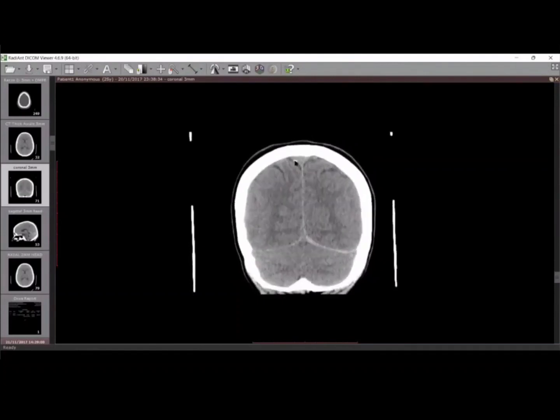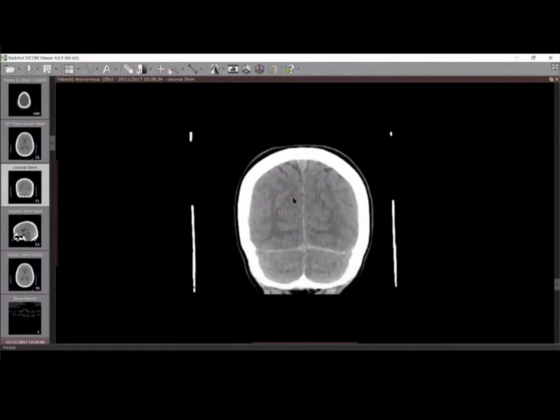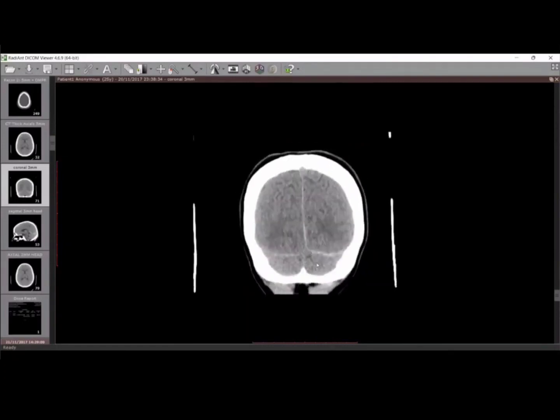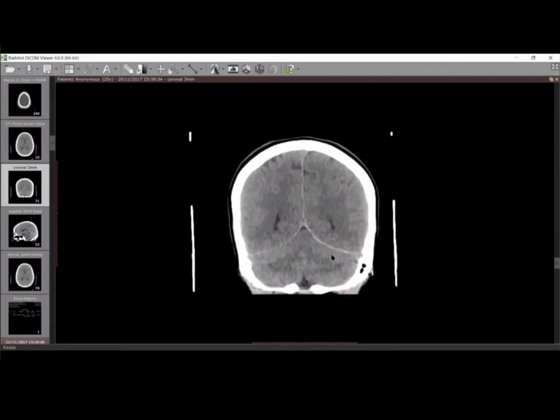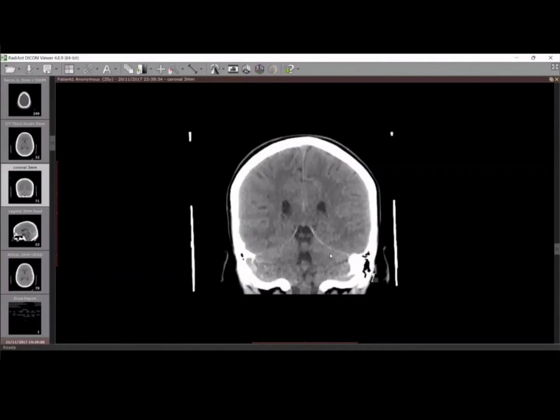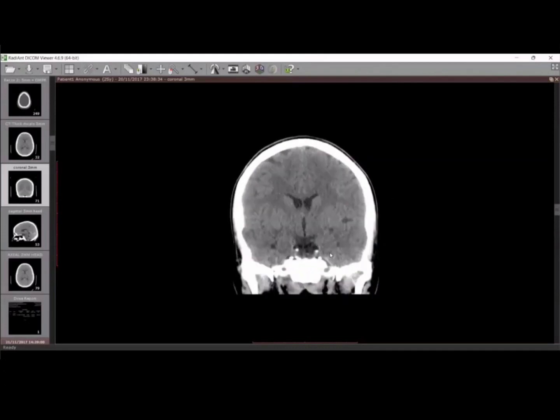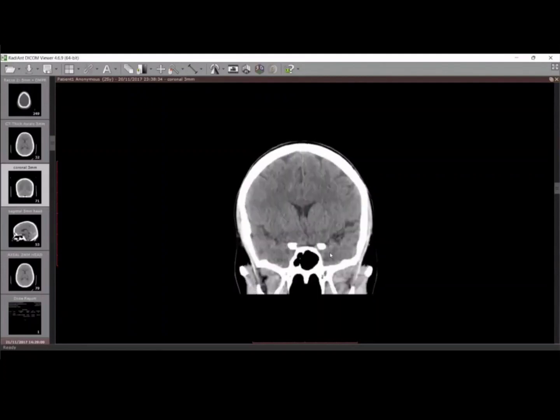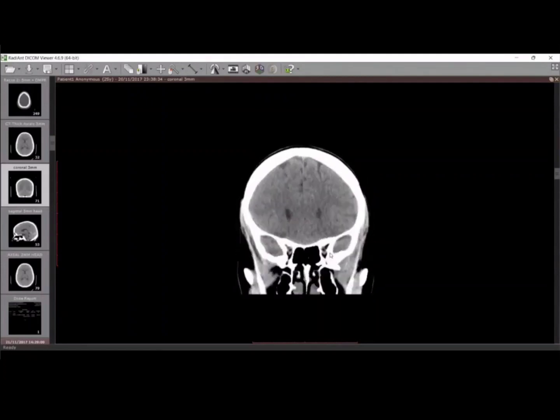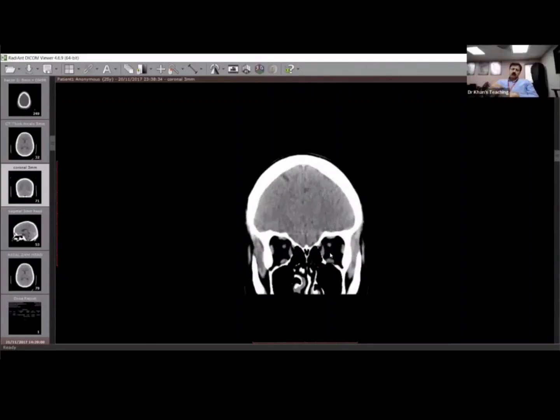This seems to be outside the brain parenchyma. These are calcifications. But I have two concerns here: the tentorial subdural hemorrhage and a subtle hyperdense focus, which I saw in the left cerebral hemisphere. I will of course see the sagittal images as well and ask the clinician regarding the Glasgow coma scale in this case. And if the Glasgow coma scale is low, then an MRI would help further in evaluation of diffuse axonal injury. Glasgow coma is 15 actually.